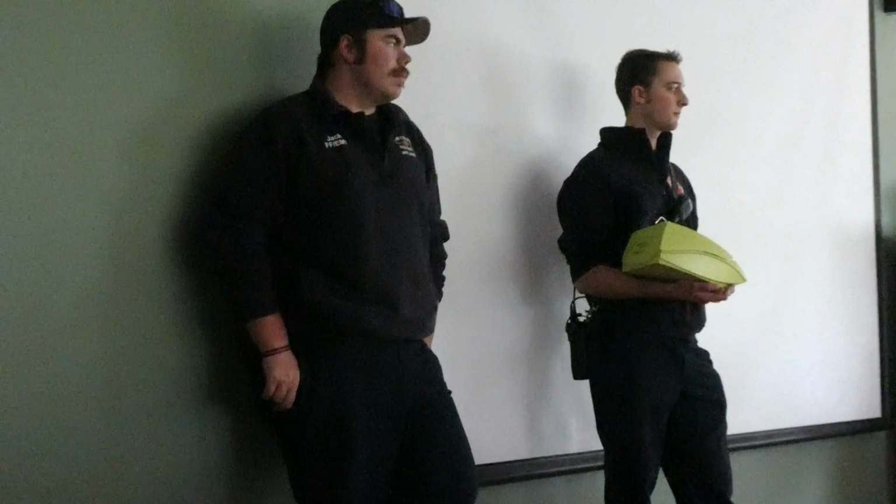So I heard a question, what about pacemakers? If somebody has one, generally, don't worry about it. Of course, you can usually tell if they have a pacemaker, there's a scar there. But if they have one and you think they need an AED, don't hesitate to just throw the AED on them.